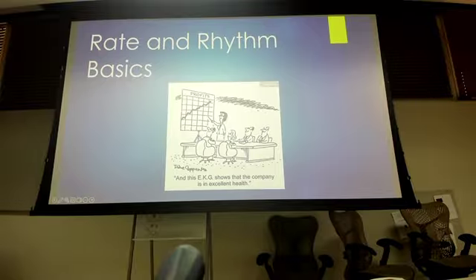T wave. Normal parameters for T wave. Remember T wave, a lot of times we're talking about amplitude, 5 millimeters in the limb leads, 10 millimeters in the chest leads. So we've got to know that because then if we're beyond 10 millimeters, what are my differential diagnoses that are associated with T wave enlargement? So T waves that are taller than normal, high voltage T wave.